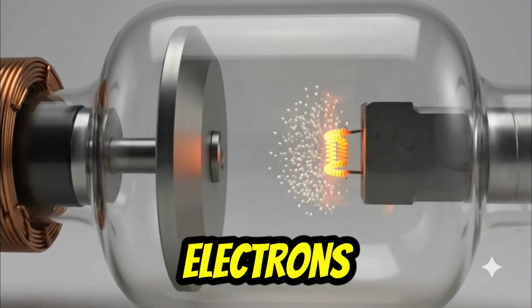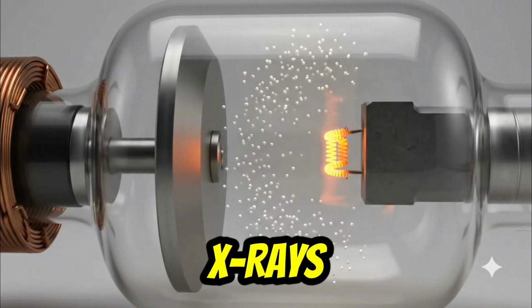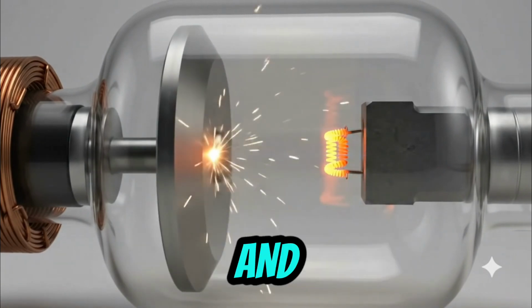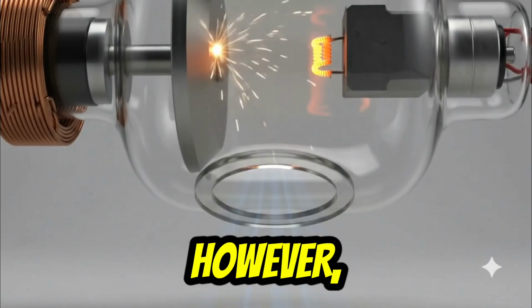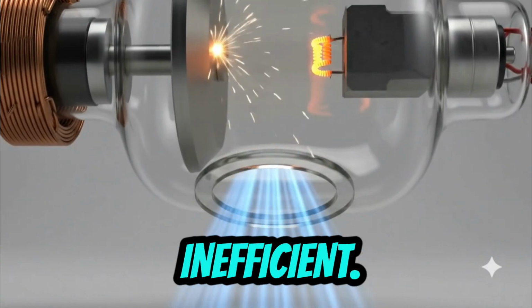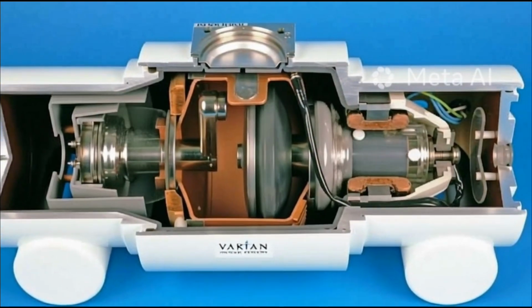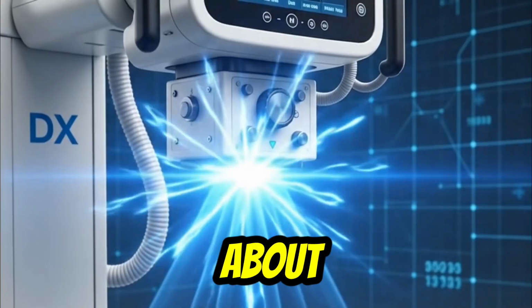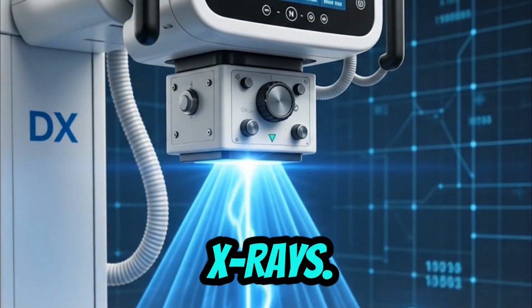When the high-speed electrons strike the tungsten target, X-rays are produced through two mechanisms, Bremsstrahlung radiation and characteristic radiation. However, X-ray production is highly inefficient. Approximately 99% of the electron energy is converted into heat, while only about 1% is converted into useful X-rays.